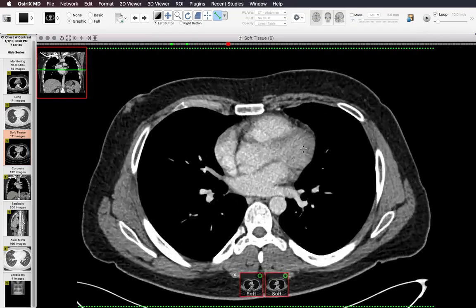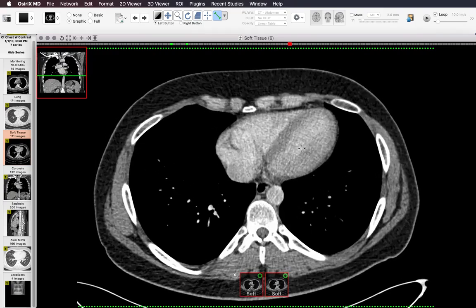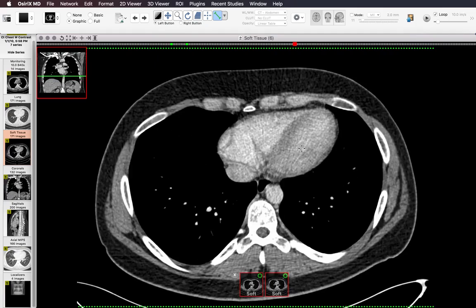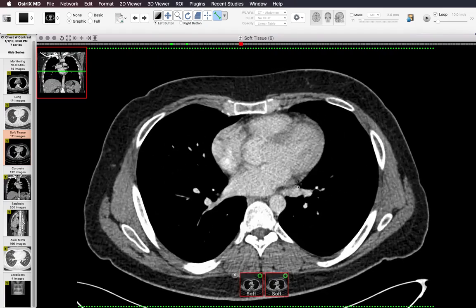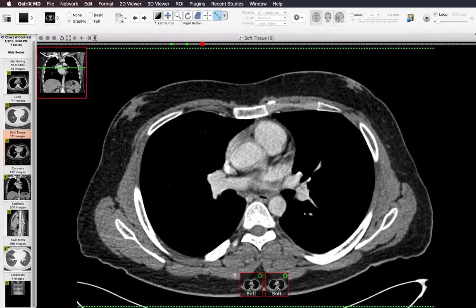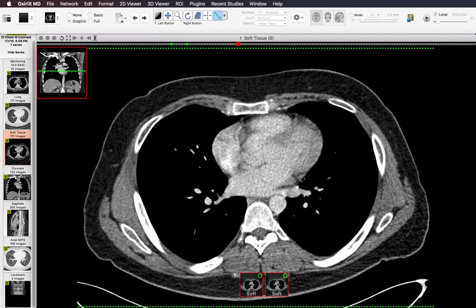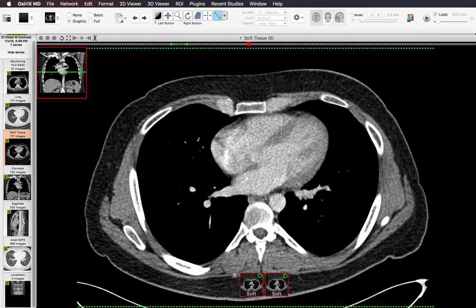And then I look at the heart itself, looking at each chamber, making sure that it's not enlarged and that there's no filling defects. The left atrial appendage is a common place to get thrombus formation, but not all filling defects that you see on CT equate to thrombus. You can get unopacified blood from eddy currents as well as trabeculation of the muscle causing filling defects.